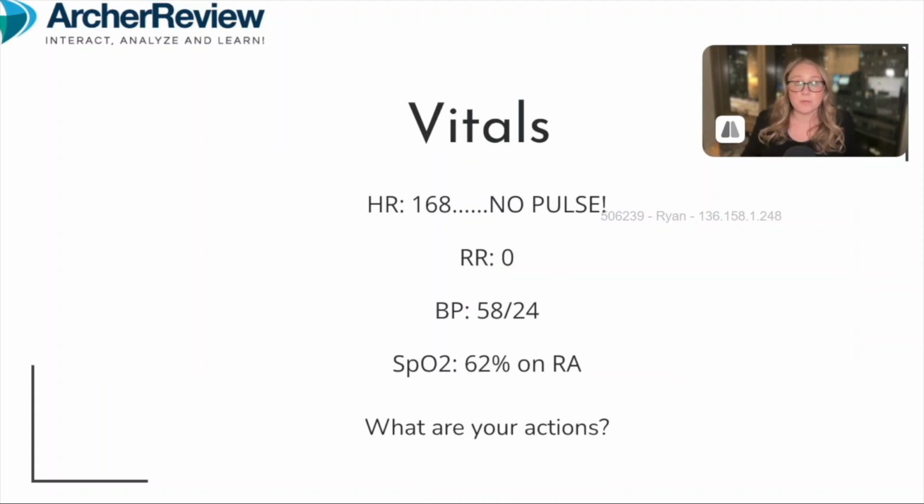And even though the monitor is showing me a heart rate, this client doesn't have a pulse. That means that my ventricles are contracting wildly. We've got crazy ventricular tachycardia going on, but it's not producing sufficient cardiac output to actually send blood forward and give this client a pulse. They're not breathing. They're even more hypotensive and desaturated. So VTach without a pulse, what are my 3 actions? Pause again and jot it down.